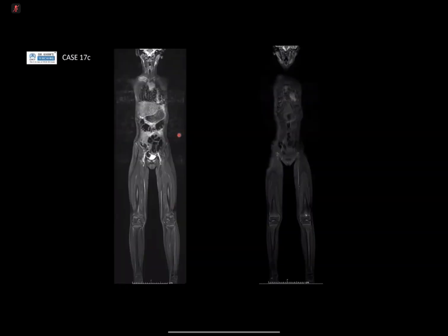Nowadays, with whole body MR, people use it to see if there are any other sites of asymptomatic disease, and often you're thinking of the knees and ankles. It's one of those sites, and you're looking for metaphyseal involvement, but often it can cross the physis and involve the epiphysis as well, as in this case. So this was discussed at the bone tumor unit, and given the MR findings, this was more likely to be CRMO.